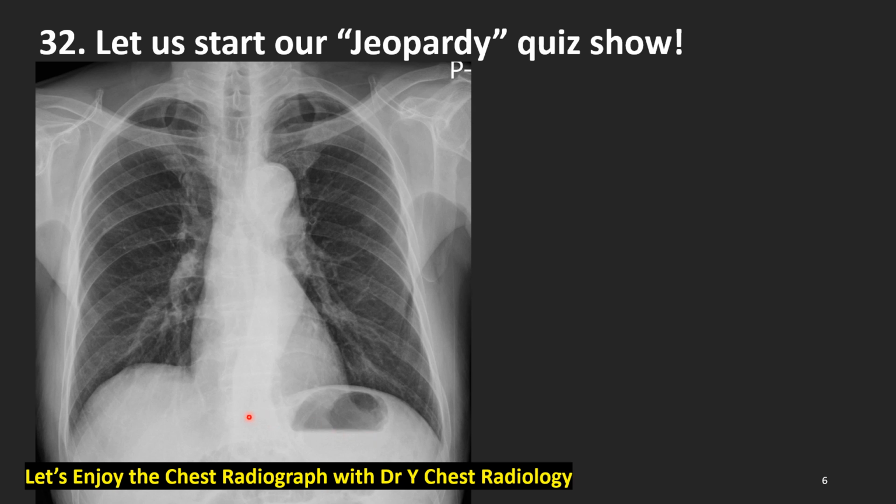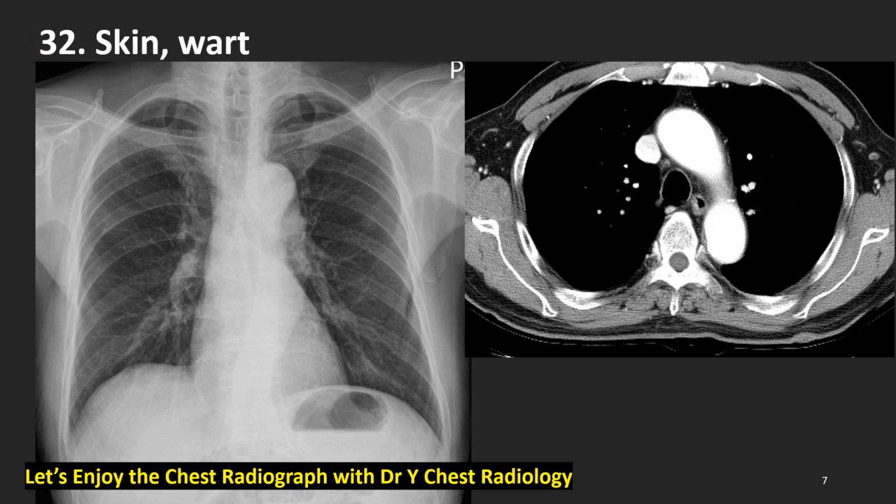Where is the pseudonodule? Yes, on the left. Where is it? This one. What is your answer? What is this? The answer is skin wart. This is axial contrast enhanced CT. Where is the skin wart? Did you get it? Here. This is the wart. This is it.